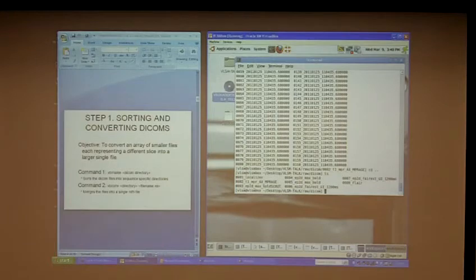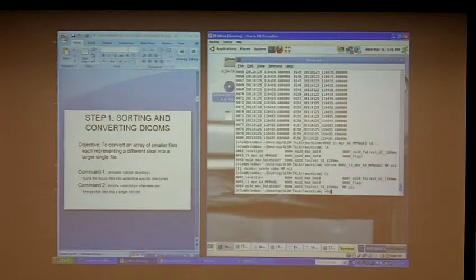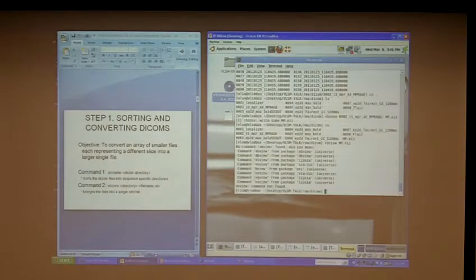So the next thing I want to do is compress them into a single file, and we use the vbconv command. I give it the name of the directory and what I want to call it, and it's going to go through and give us a nice single file, which we can look at.